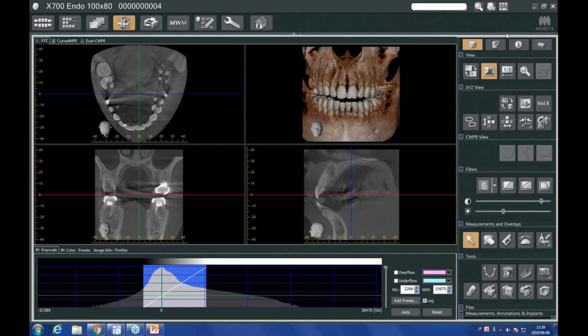On the right side here, this tool panel, down in the filter section, you'll also see a brightness and a contrast slider bar. So I can go ahead and adjust just the same way by dragging these bars. So if you come from an imaging background where you had brightness and contrast sliders, you can of course adjust them by using these sliders.